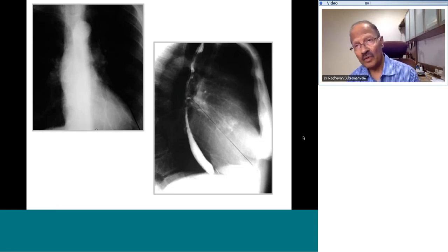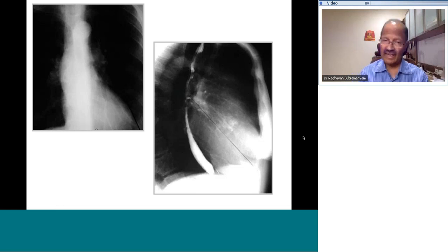Although the contour in the frontal or postero-anterior X-ray is useful, occasionally you do need to go to the lateral X-ray to diagnose chamber hypertrophy. This shows a normal chest X-ray in a lateral position. Please note that the right ventricle doesn't appear in the borders of any frontal X-ray.